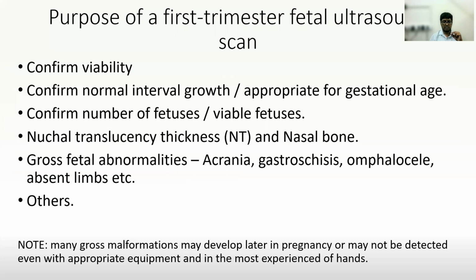But during the first trimester screening at around 12 or 13 weeks, sometimes we might see one fetus developing better and the other fetus might not develop, or might just die. The fetus might not have a good heart rate, or might be very small. That becomes an unviable fetus, and the fetus that is growing normally is a viable fetus. So that is very useful for the FTS scan.